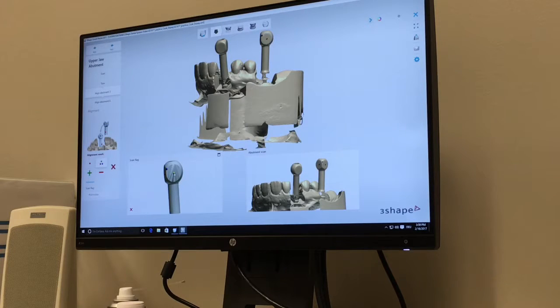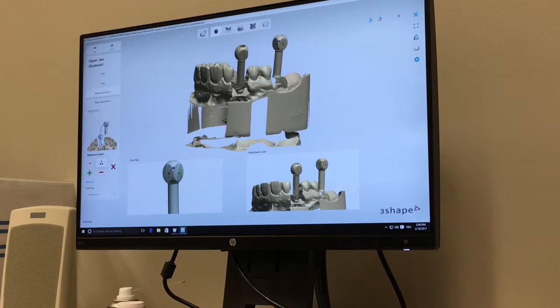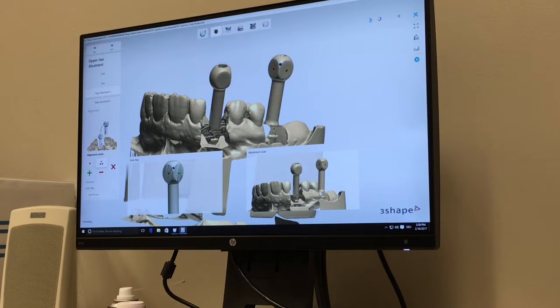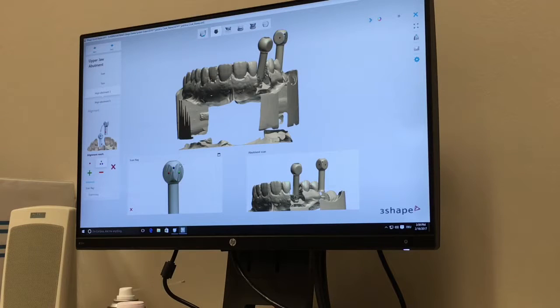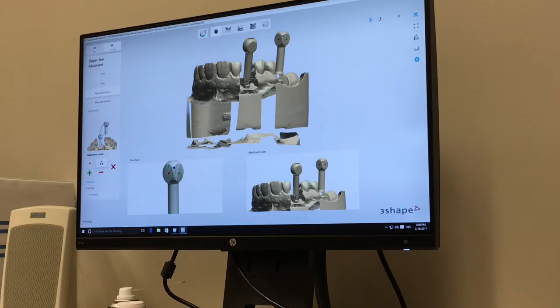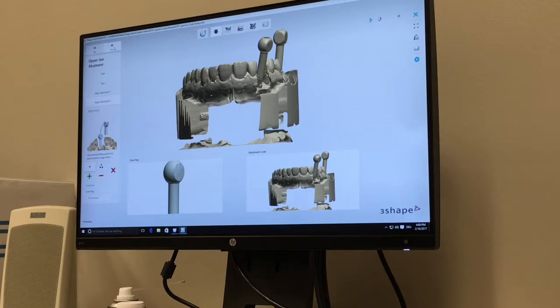I probably don't even have to mess with it, but in the pros world, we're pretty crazy about being as accurate as possible, so we're gonna go ahead and make those perfect. Okay. All right, so accept it. Go to the next process.